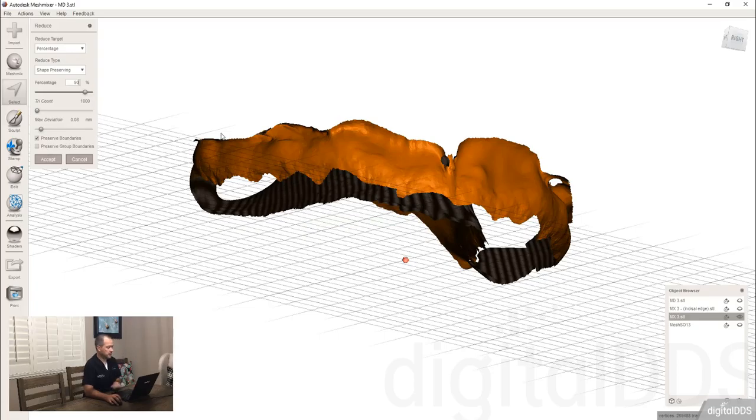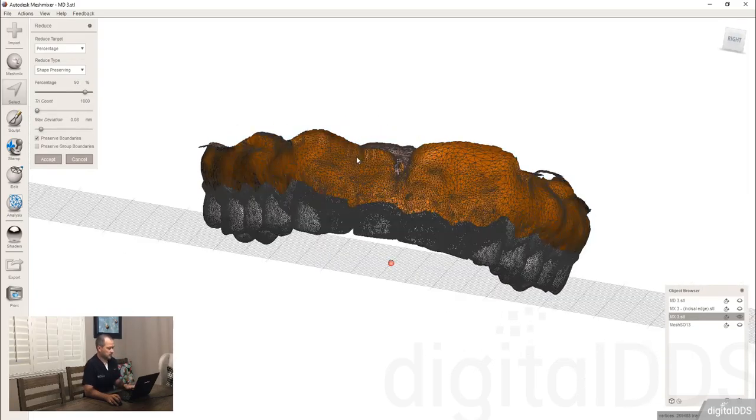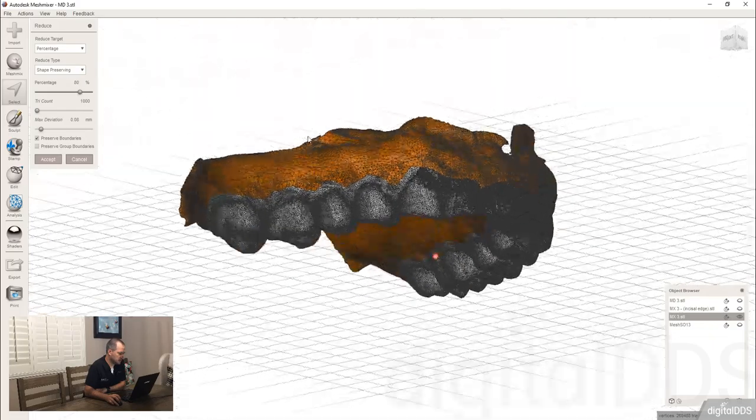Okay, I'm going to turn on the wireframes and see if we're happy. Okay, where'd that go? Wireframes. So that's probably more aggressive than I really intended. I'm going to drop it to 80 and we'll see if we're happy with that. I was noticing before I turned on the wireframes that everything looked a little too blocky, and that's what led me to think, maybe this isn't quite what I want.